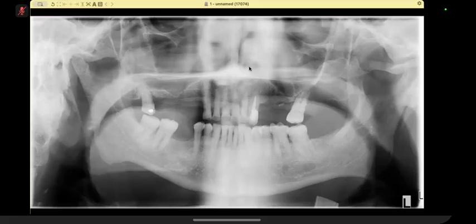So look at the upper alveolar process of the maxilla. Anything? So there appear to be some erosions out here, sir, in the left. Okay. What would you like to do next? Sir, I would like to further evaluate this patient with an MRI or a CT.